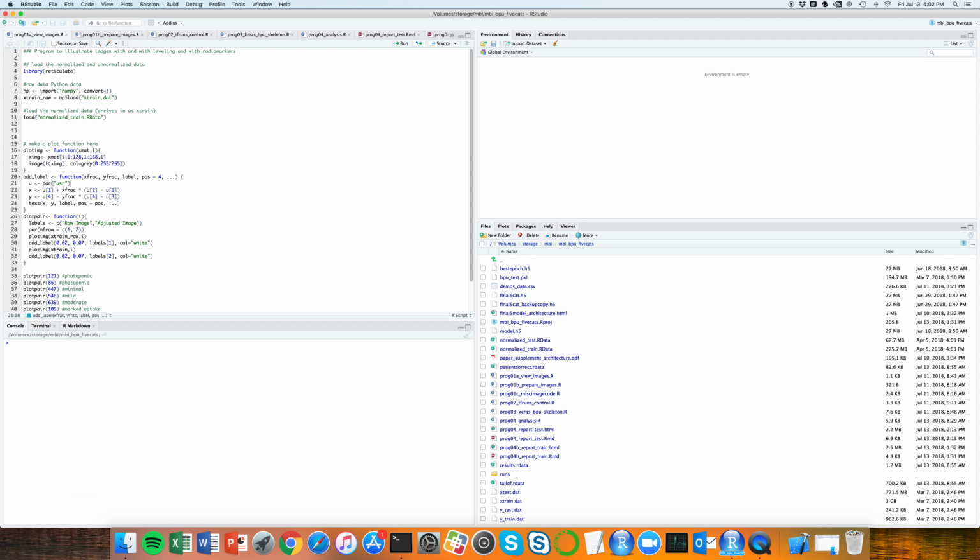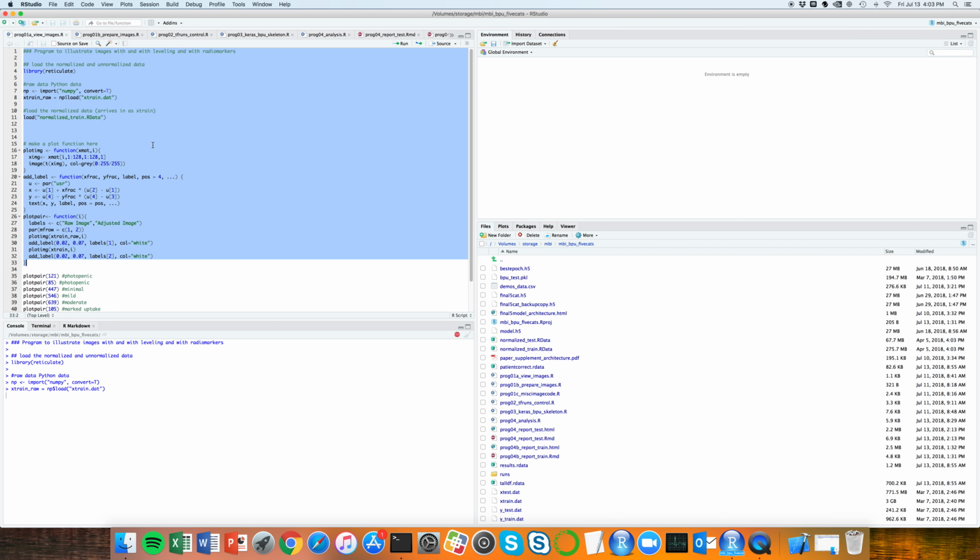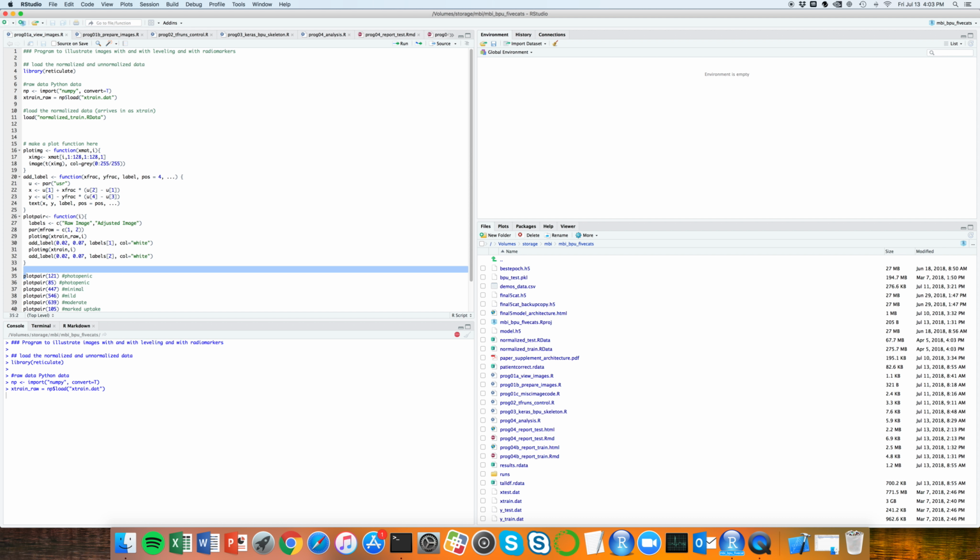As you can see, I'm using R to do the deep learning. It's configured so that it goes out and calls TensorFlow through the reticulate package. So I'm going to load some data. This is looking at our raw image data. I'll create a couple of helper functions to show what the images look like. One of the things you'll see here is we need to do some minor image adjustments. So I'm going to load the raw images as well as the post-processed images that accomplish something known as window and leveling, in radiology speak.